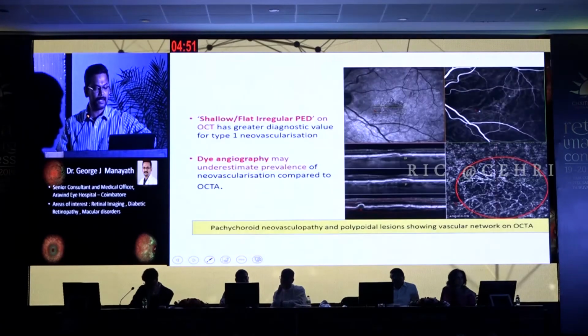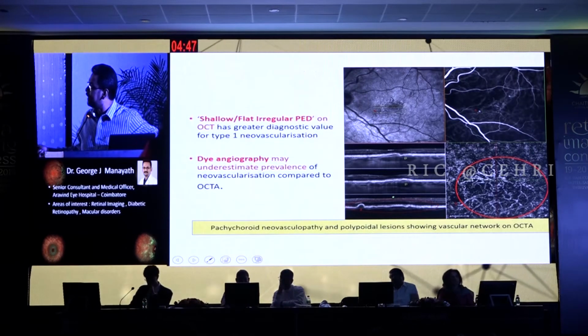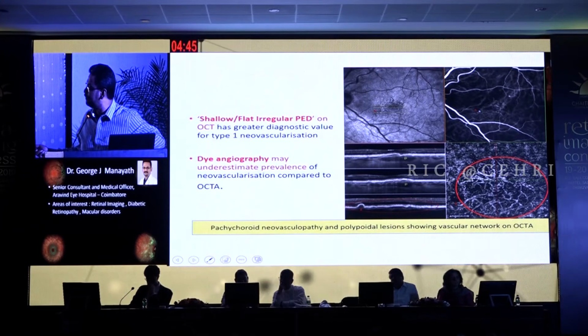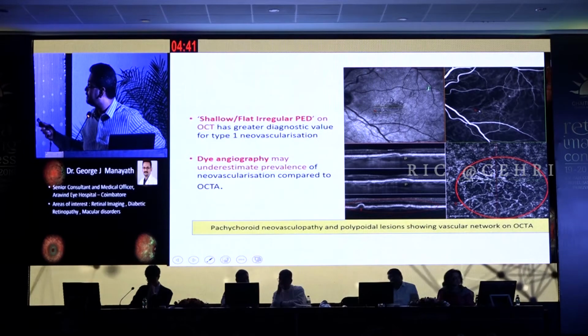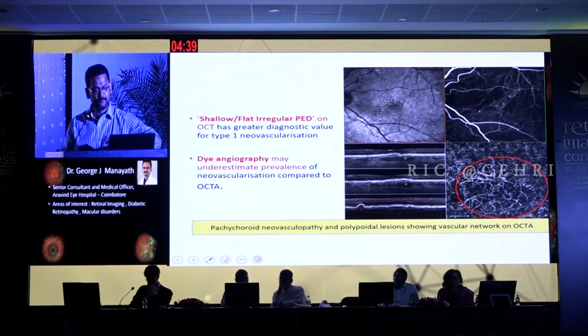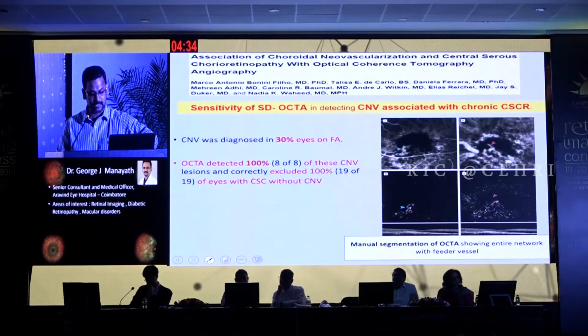And flat irregular PEDs like this have a greater diagnostic significance of picking up type 1 neovascularization on OCT angiography, whereas the dye-based angiography may in fact underestimate the prevalence of neovascularization compared to OCTA.